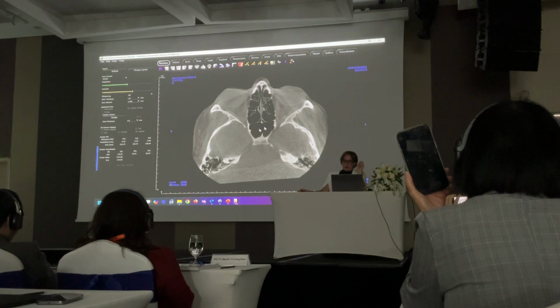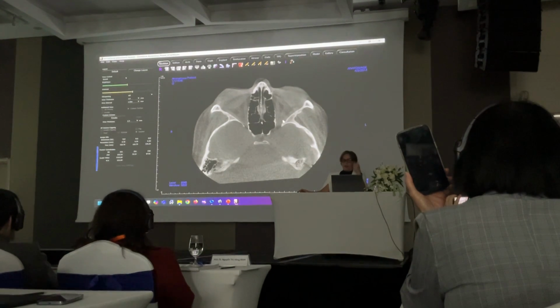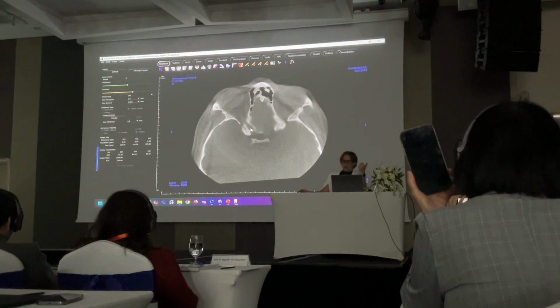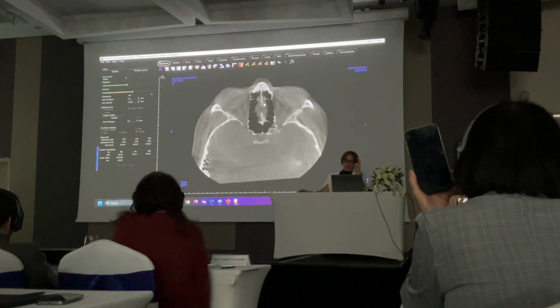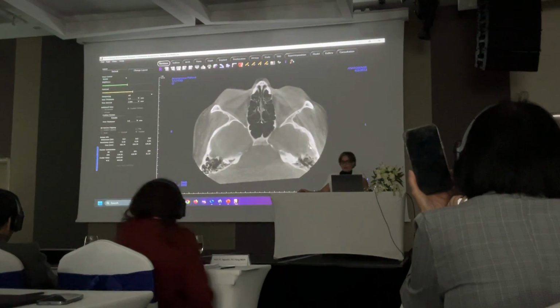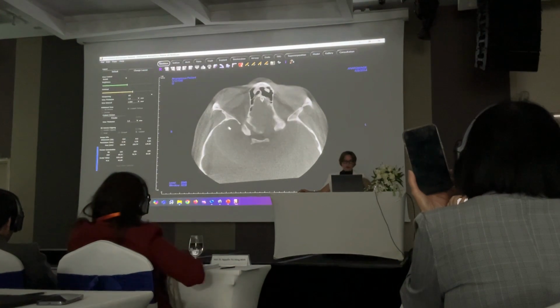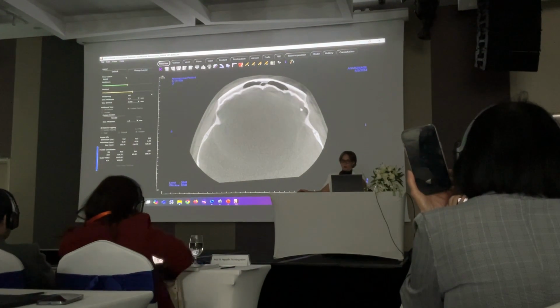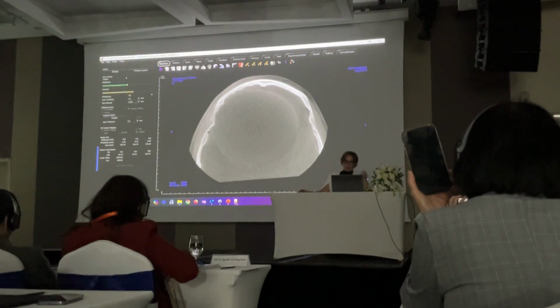And then this is the superior orbital fissure, which has cranial nerves 3, 4, first division of 5 and 6 go through. This is the sella, this is dorsum sella, and then moving all the way to the optic canal, which is cranial nerve 2, and this is cranial nerve 1. Okay? We're looking at all these bones, making sure that the cortical outlines are continuous, the medullary spaces are uniform, focusing on all this stuff.